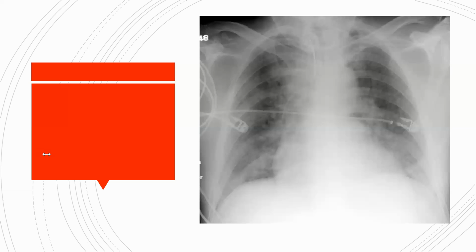Okay, so some people are saying infection, some people are saying TB. Good thinking. I see what you mean, it just does a lot of fuzziness everywhere, isn't there? I'd be worried if this patient had TB because it would be literally everywhere. And again, he has lines from a sort of ECG machine, a 3-lead ECG.